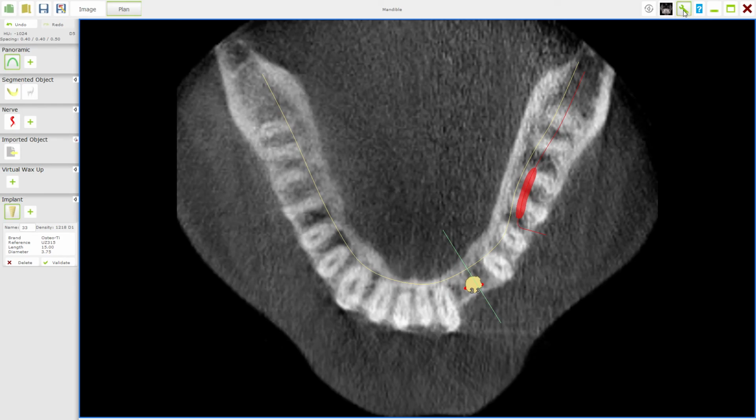So we can look at that as well, and we can go to our measuring stick. And from the root, I'm going to make a click on the root, double click that there, and I can click to there, and I can measure that distance between the click, and I'm just going to move that to there. Right, and we can see that that's 9.6 millimeters, which is quite wide for a canine. So we'll look at that in a bit more detail on the clinical pictures and on the final restoration.